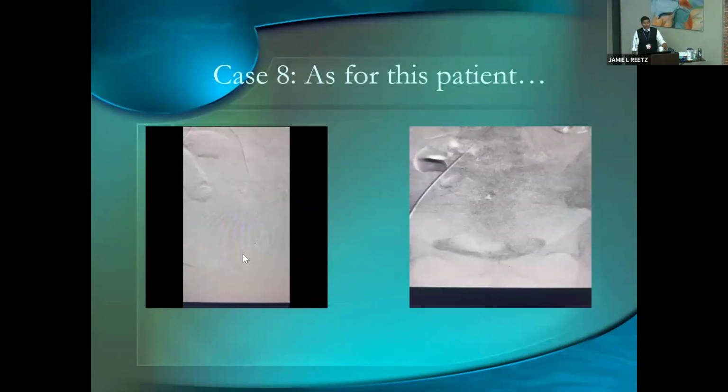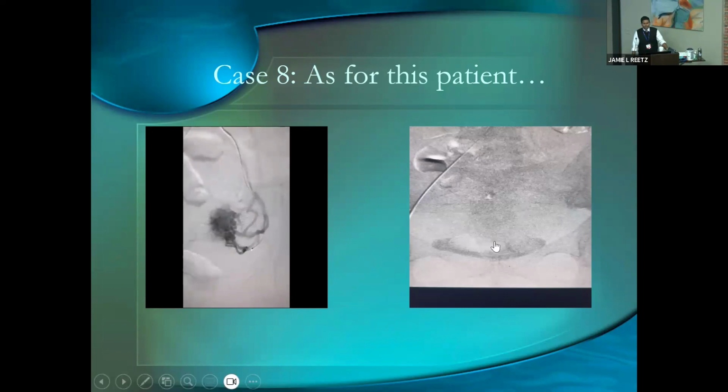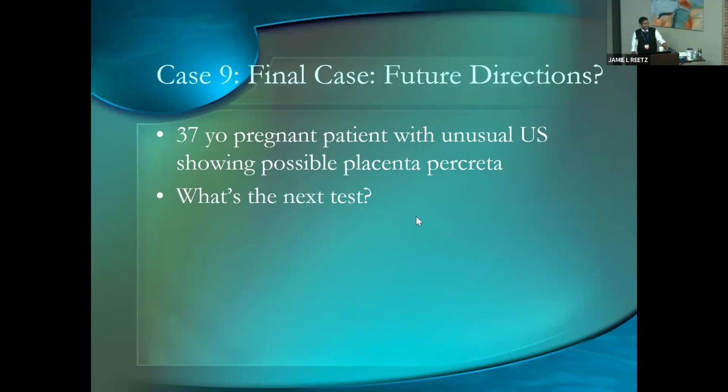This patient ended up doing well. You can see on the angiogram, this was RPOC that was highly vascularized, taking up a lot of blood. Afterwards, Conrad embolized her. He did UAE, which is weirdly not playing, but just pretend that's what it looks like, because nothing happened. Essentially they cured her of that bleeding.